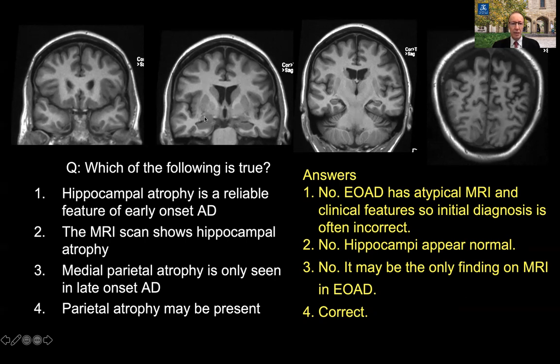And we've got a bit of amygdala here and hippocampus here, a little bit of amygdala left there, hippocampus here. And what you're judging is the amount of CSF basically surrounding the hippocampus. So when there's hippocampal atrophy, this space widens and the hippocampus gradually shrinks. And you get also in Alzheimer's disease loss of entorhinal cortex and other cortical areas around the hippocampi. In this case, there's a tiny little bit of CSF there, but that's well within normal limits.